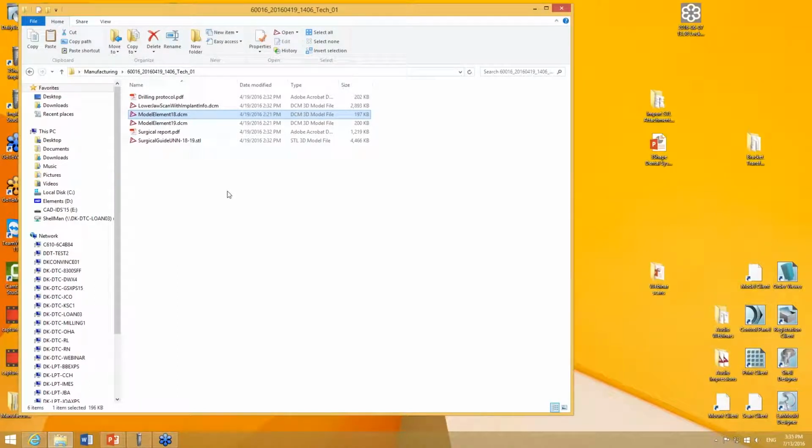So as long as it's going to be 1, 2 teeth, maybe 3 at the most, you can get it back into the dental system. But we are also looking into a solution to make it easier. It was possible quite easily on Implant Studio 2014 and 15. It's getting a little bit more tricky right now.